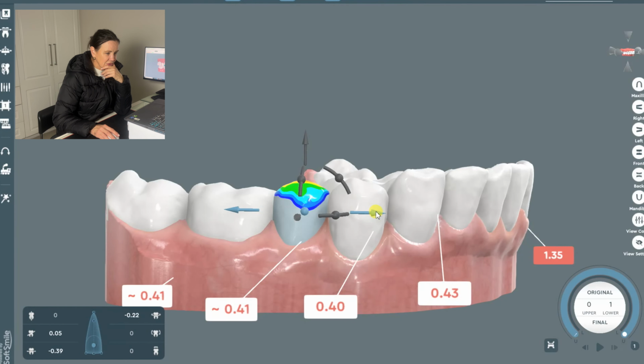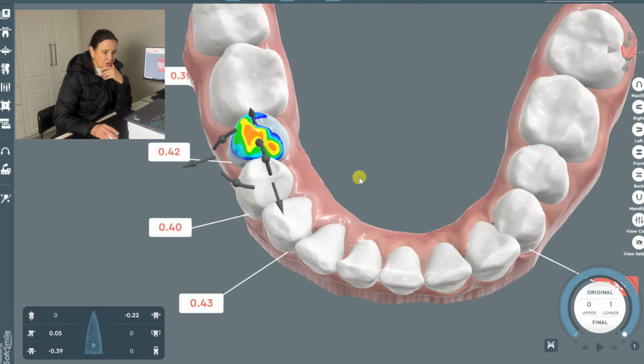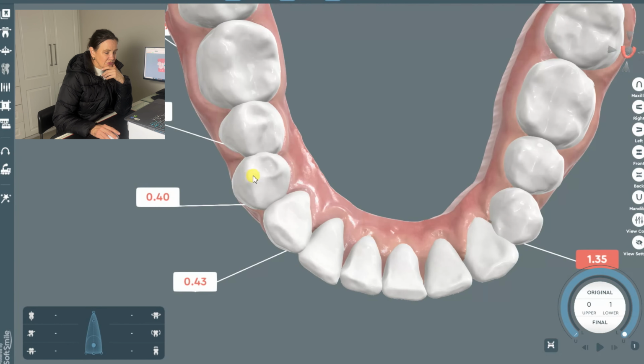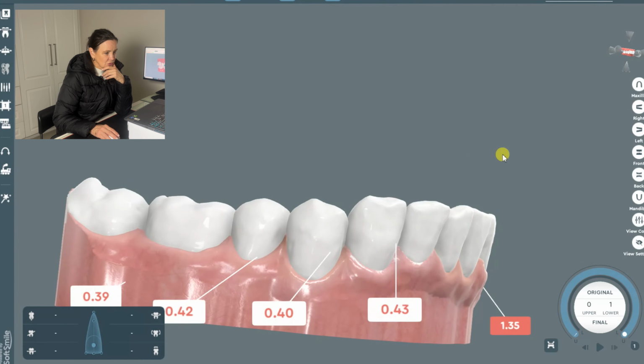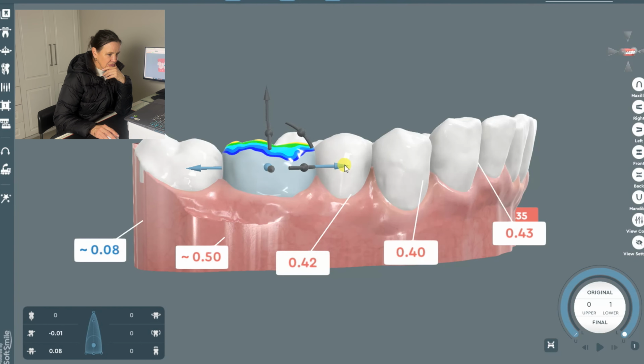So this really, when I would do something like that, is if we've got crowns, one would start to... I'm not happy with this. I don't feel comfortable. Where does this come from? There shouldn't be.